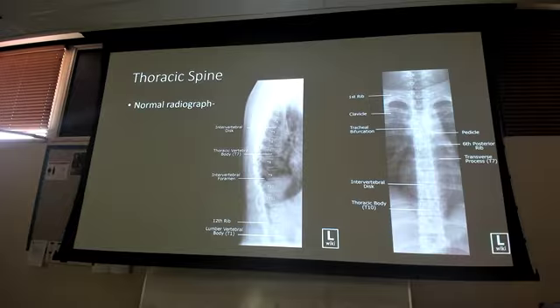Now with the AP, I could do it, because all the thoracic vertebrae have what attached to them? Ribs. So at the very bottom, you see one with ribs, and the one below it doesn't have ribs. Well, that's T12 and L1, and from there you could count up, right? But I didn't give you a vertebra on this picture without ribs. So how are you supposed to know that's 12? You're not. So I would have to give you that, but as far as counting on the lateral, it's too difficult. I'm not going to make you do that.